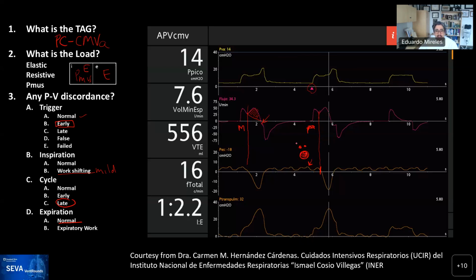That's the surprise face of an individual looking at this. And so the message is that this one over here is a false trigger. So you have an early trigger, you have a false trigger, which in reality was an early trigger too, but it was triggered by the oscillation of the heart, and then a really passive breath in this patient. So really interesting. Rob, any comments?